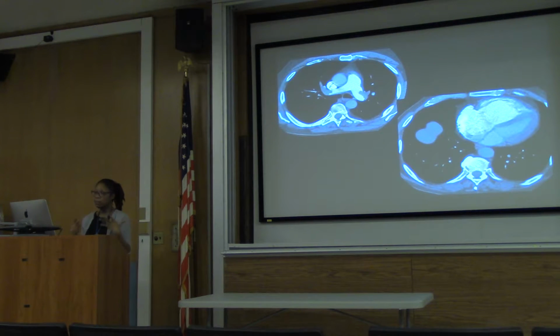When you have a large clot, it predisposes the patient to subsequent heart issues like pulmonary hypertension. And the question is, how can we tell pulmonary hypertension on CT? There are a few things that we look for, right? Looking at the heart, we can see here that the right ventricle is quite dilated, the right atrium is dilated, so the patient probably has some element of right heart failure going on. The septum here, which should be either straight or slightly bowed to the right because of the lower pressure, is actually bowed to the left, and there's a significant decrease in the size of the left ventricle. So when I see this, I suggest the possibility of pulmonary hypertension associated with that clot.